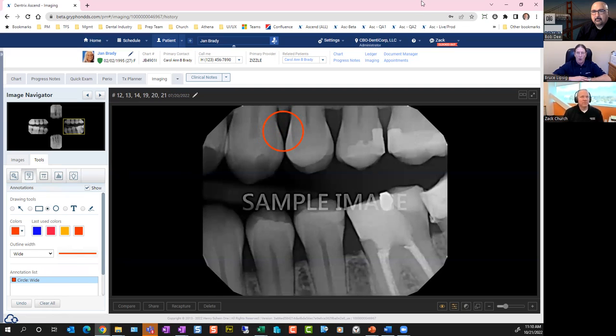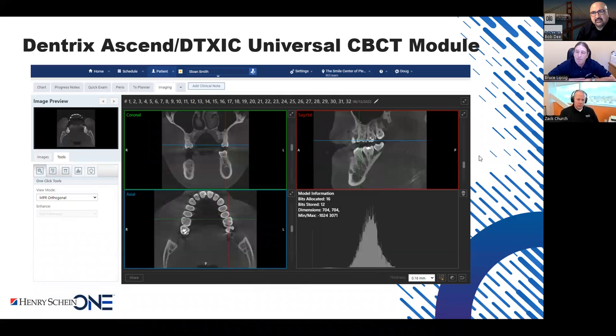Yeah. We basically order those X-rays from the practice management. We order those cone beam volumes. So there's an entire audit trail, shall we say, on each image. Right. Bruce, you mentioned CAD CAM, and I saw something in there as well. Is that also coming? Well, CAD CAM capabilities are already in there, and they've been there for a while.